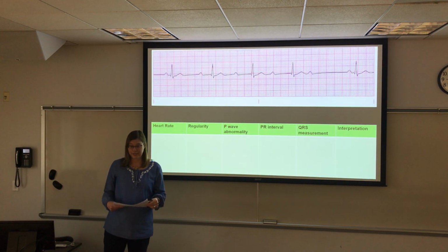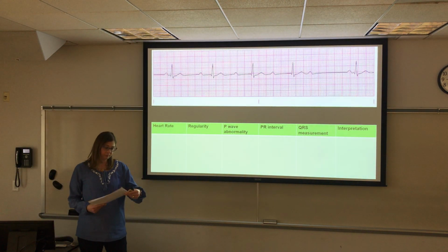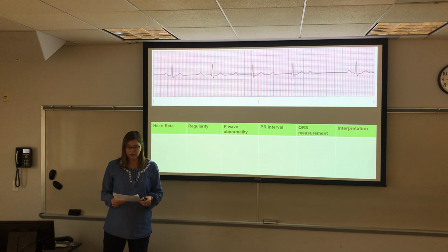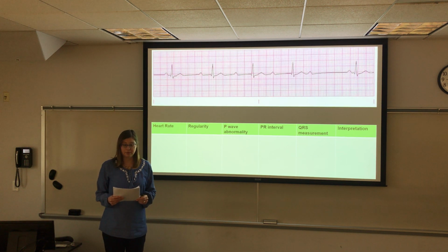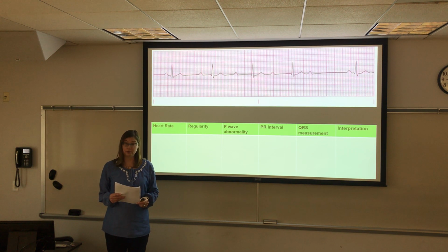So let's go over the case studies. You're caring for Mr. Heartbreak, a 72-year-old male with a history of an inferior MI. He's been admitted with digitalis toxicity. Let's use the 6-step method to interpret his rhythm strip.